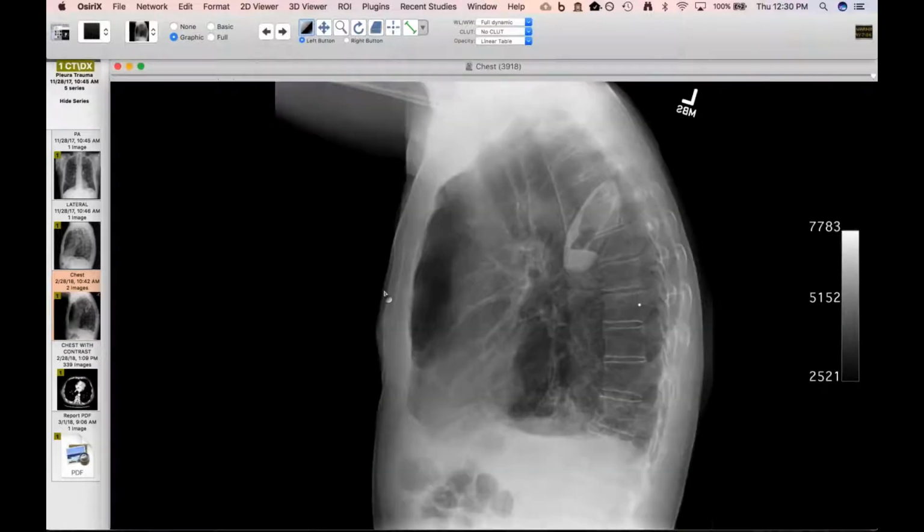I like Jeff's idea about a sort of a contre-coup tear on that side. So I think he fell on his right side. He tore something on the left, and he bled into the pleura there, and was contained in the fissure, and then sort of seeped into lung from there. Yeah, I think that's quite cool.